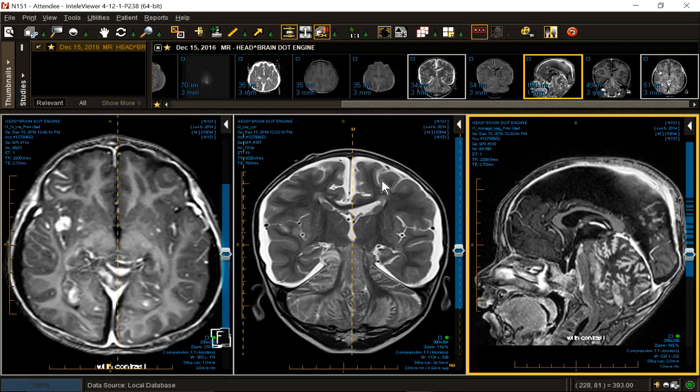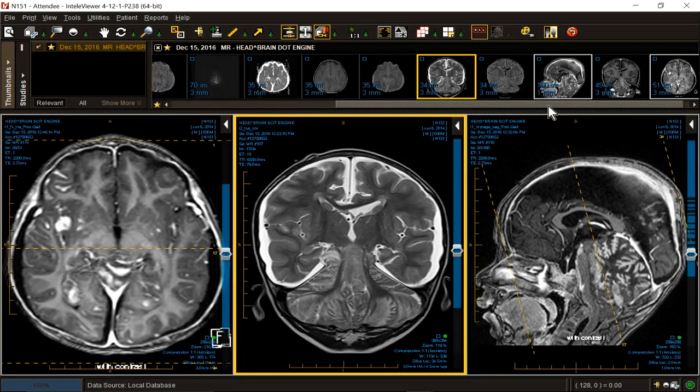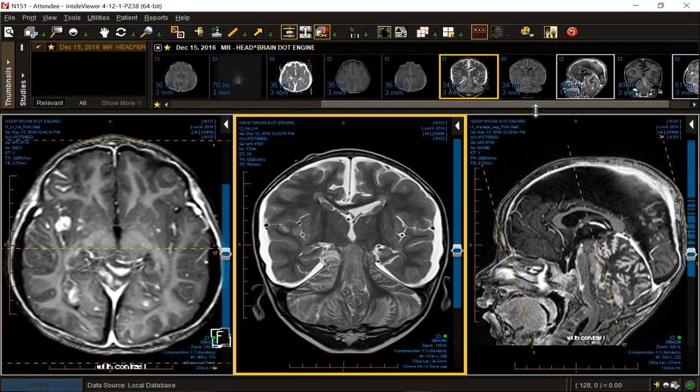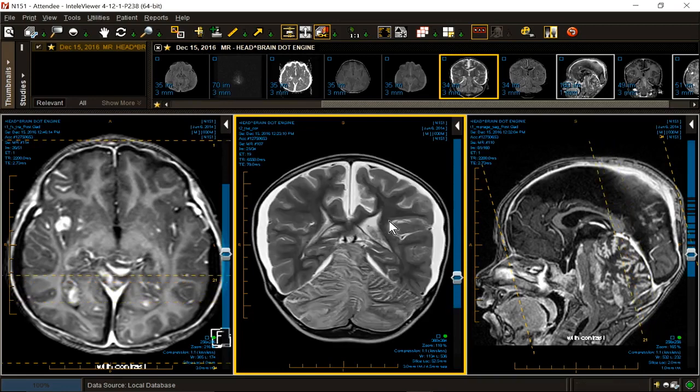It has not bled. There's probably only one reasonable differential diagnosis, and that is medulloblastoma, also known as a PNET tumor, a primitive neuroectodermal tumor, and these have been lumped together. So my number one would be posterior fossa mass, most consistent with medulloblastoma for the following reasons: A, B, C, D, E. I'd leave some of the lesser supportive information in the body of the report.